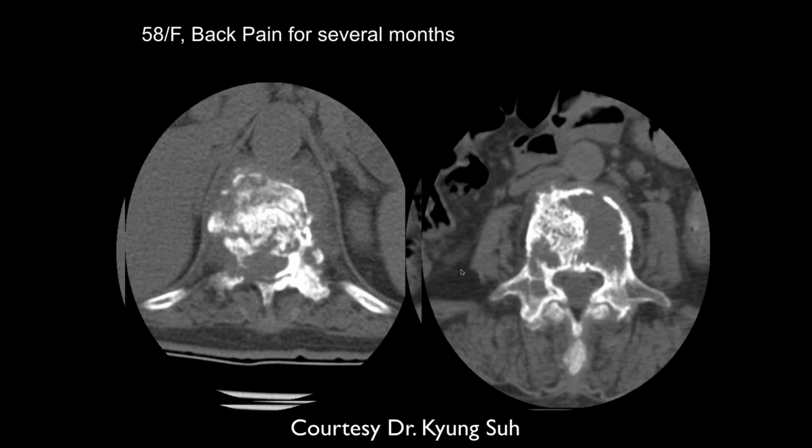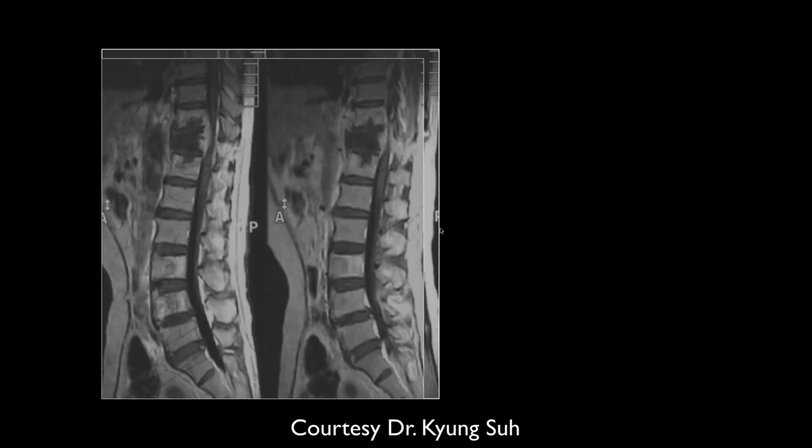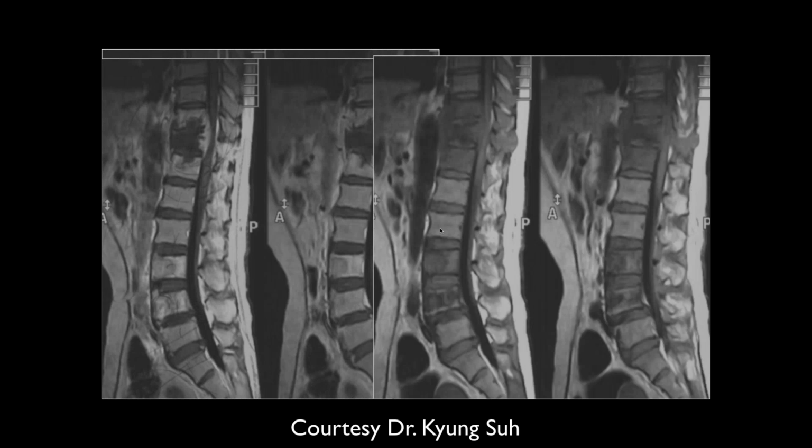Well, there's extension into the posterior elements as well. The pedicle involved on the right. Okay, so there's extensive involvement and some multiple levels of 3 up here, 2 down here. We've got all this soft tissue maybe anterior. Soft tissue collection. And then we've got a lot of involvement in the compression of the inferior cortex here. What is this, later on or something? It's all the same time.